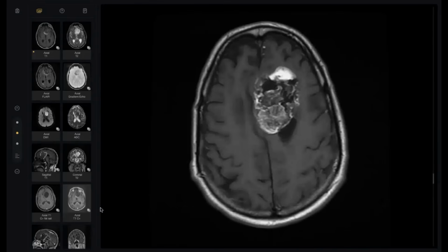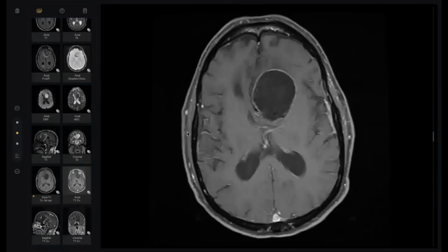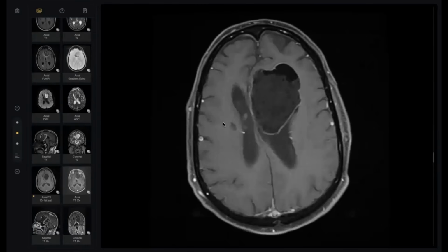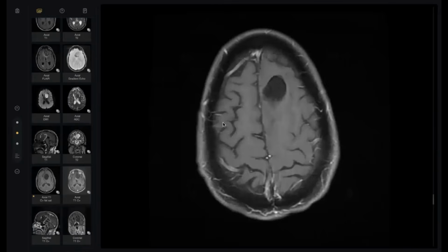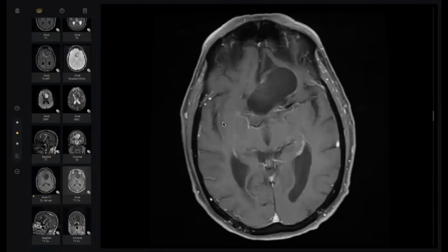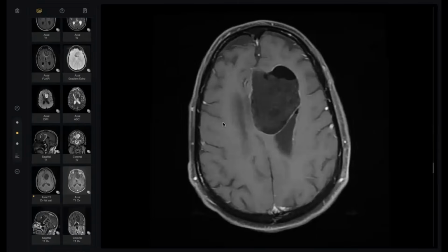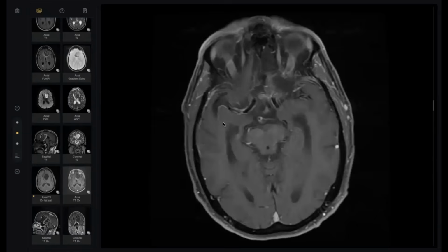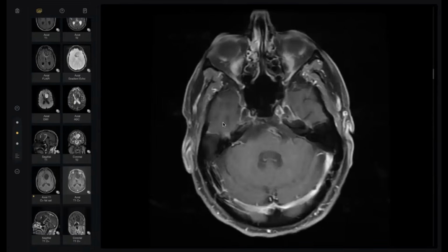Number three, if you get the post contrast, and this is very good, a 100% sure sign, because post contrast must be fat saturated. Look here. What happened? Complete suppression. So you are sure this is rupture dermoid.